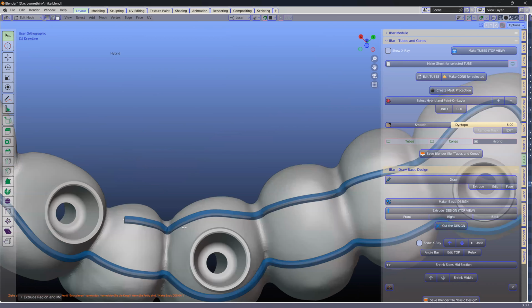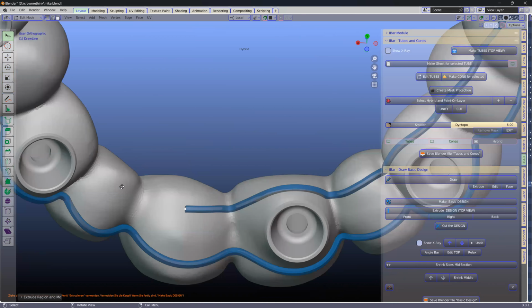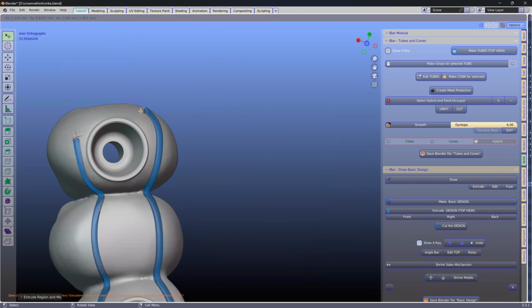And here what we're doing is we're just going to design our structure. Now it is important that you think about space as well. So you need enough. Then you're going to either click here and then F, or you're going to click fuse over here. And that fuses the two.